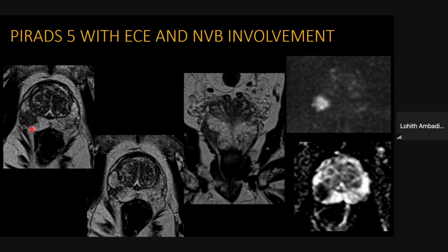Now there is a lesion here and the prostatic capsule is actually deformed, and there is a small amount of lesion outside the capsule. And that's where you can see small gray bits of neurovascular bundle. So it is actually transgressing the capsule and is invading the neurovascular bundle on the right side. So you can see how the capsule is notched like this, probably because of desmoplasia there.